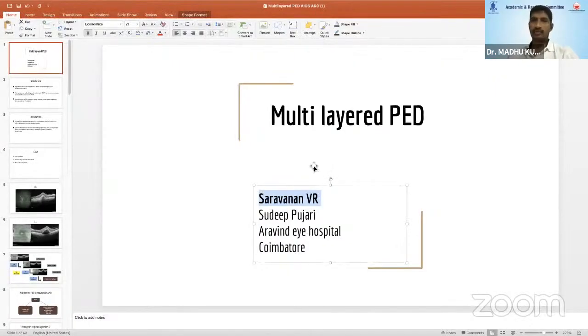Yeah, so at the present moment, SHRM is a vague term. As I mentioned, it consists of fibrin, blood, and all these products put together, and probably a part of the CNVM itself, and it changes its morphology or consistency with subsequent treatment or time. So we need to look at it as a changing pattern, and multimodal imaging, as I said, is more important. Just looking at it on an OCT and deciding will not be possible.